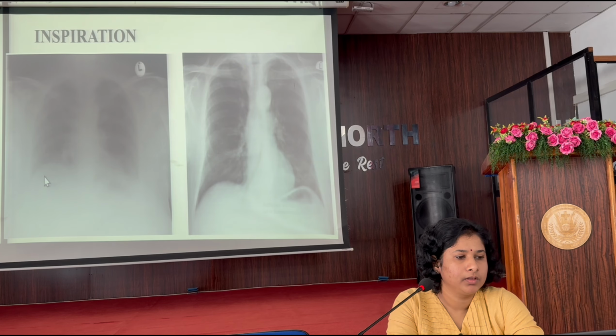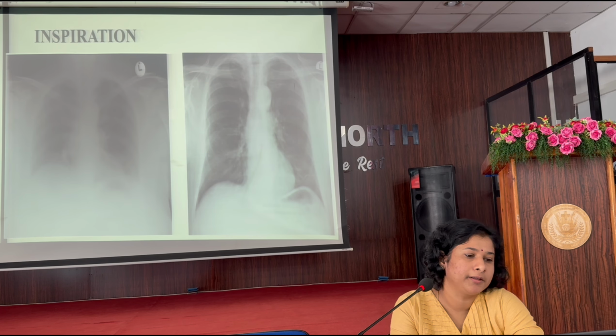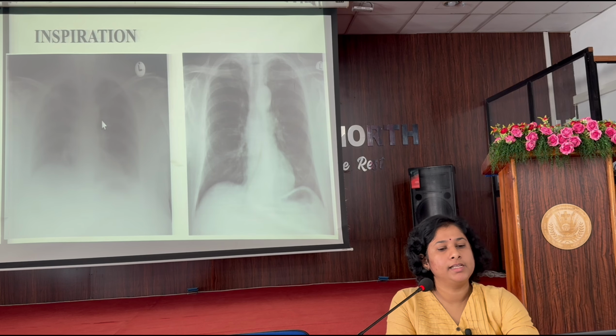Second, we have to check for inspiration, whether the patient has taken adequate inspiration. The first image is taken in an expiratory phase, and the second one is in full inspiration. You can see the difference very clearly.